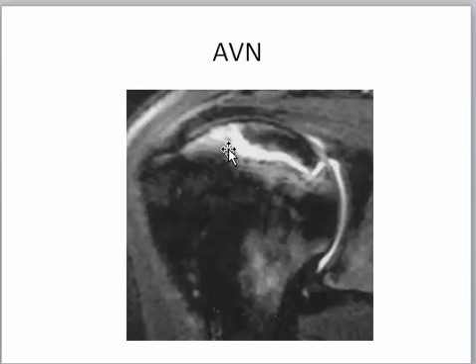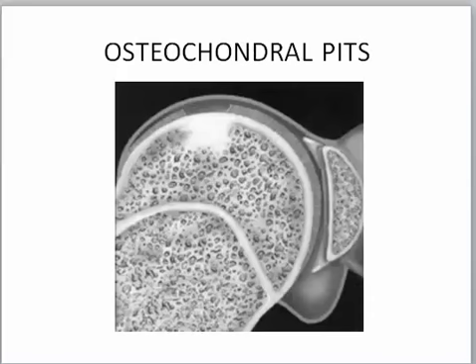And of course all of us know about that. This is the AVN, or avascular necrosis of the head. Here sometimes we get this appearance.